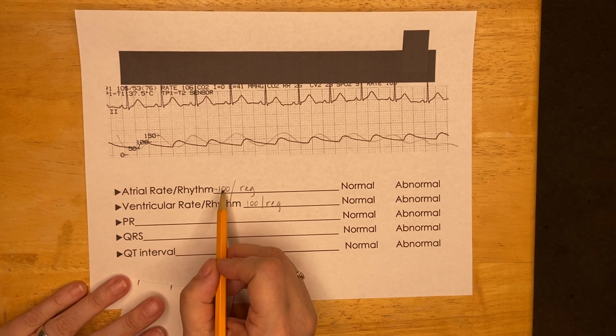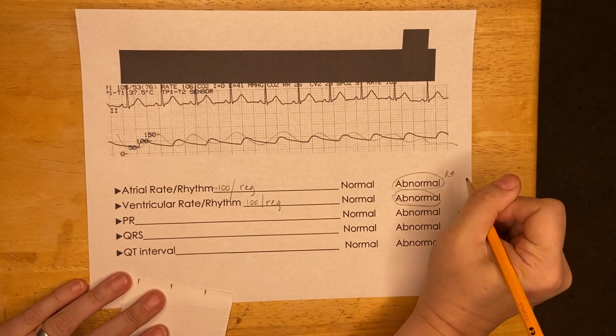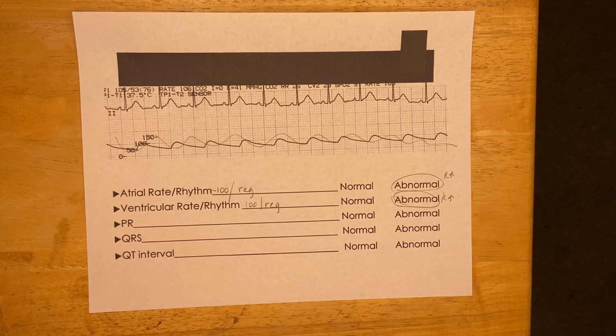So we're probably a little bit over 100, so I think we've got the same thing that we had before, in that the rate was a little bit high. But otherwise, the rest of it looks okay. So let's take a look at that PR interval.